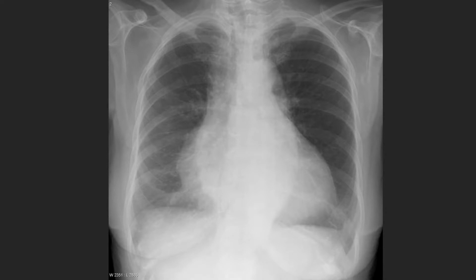Here's an example of cardiac silhouette enlargement, with one green line marking the outer edge of the right atrium and the other green line marking the outer edge of the left ventricle. Here's the distance from the right atrium to the midline. Here's the distance from the left ventricle to the midline. And then the 2 green lines here representing the total width of the chest, which is outlined in this orange arrow. We then sum the right atrium distance, the left ventricular distance, and we note how they're larger than half of the total width of the chest. This indicates cardiac enlargement. In general, people do not take these measurements.